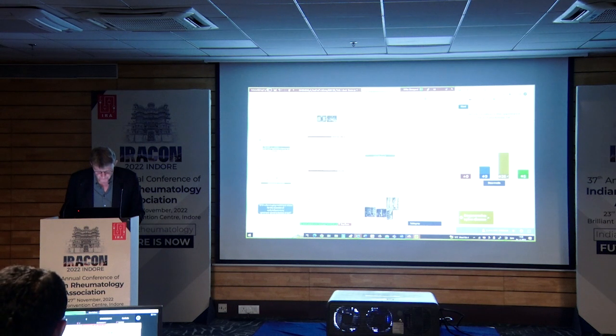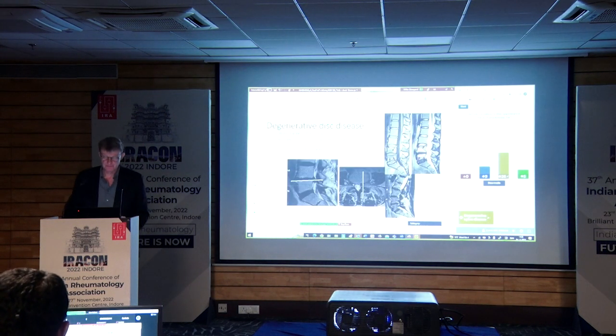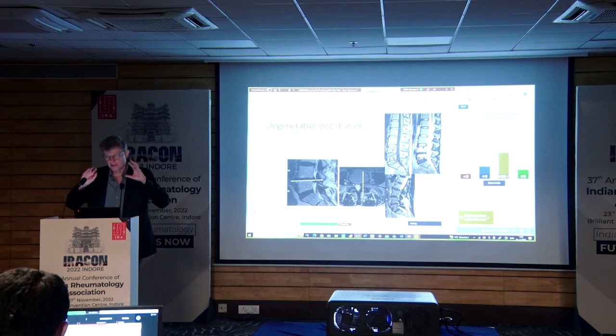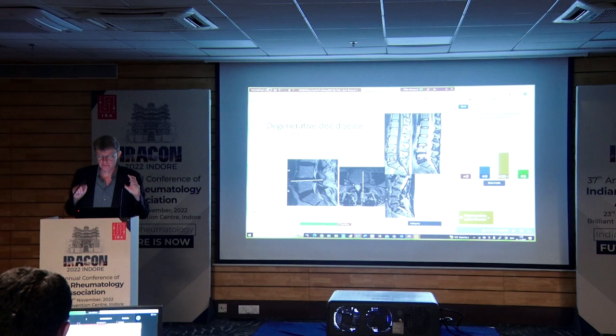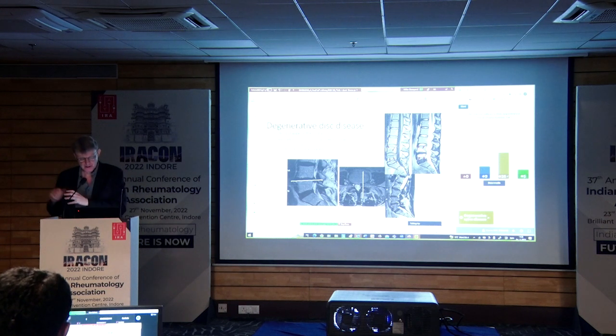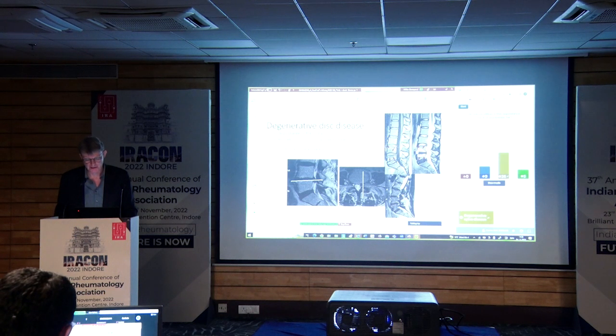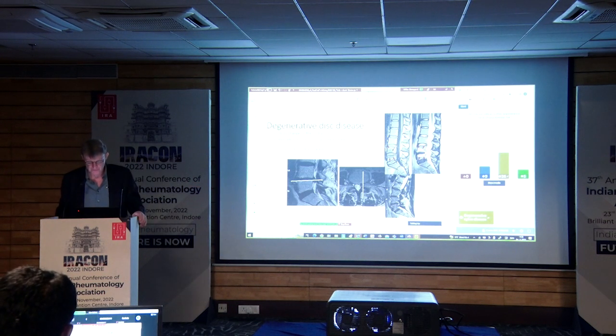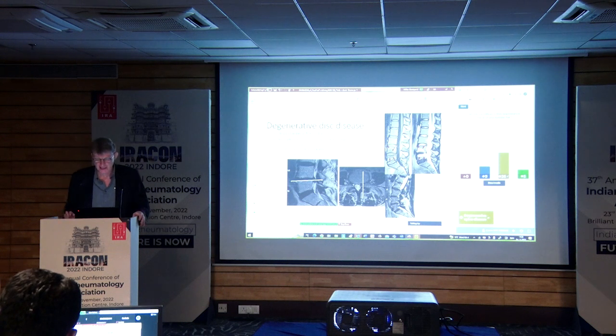So, this is from a degenerative disc disease. And when you see bone marrow edema in a vertebral end plate, then it would cross, like this, and take the width of the vertebra from the anterior end to the posterior end. And it would be bright because it's water.